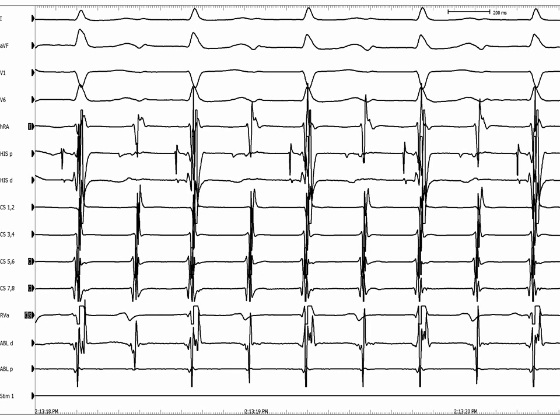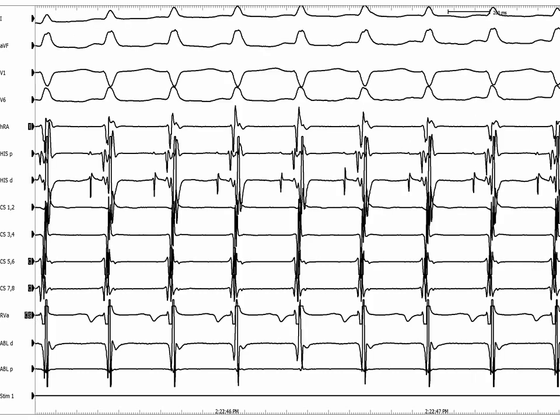And the HIS catheter recording of the HIS potential is usually reduced because there is atrial contraction without a ventricular contraction, which moves the catheter in such a way into the ventricle that moves it away from the location where it records very nicely, and tends to get a very far-field HIS recording, which is very suggestive that this is an AV node re-entry, especially if the P wave is right in the middle, narrower, negative in lead 3.